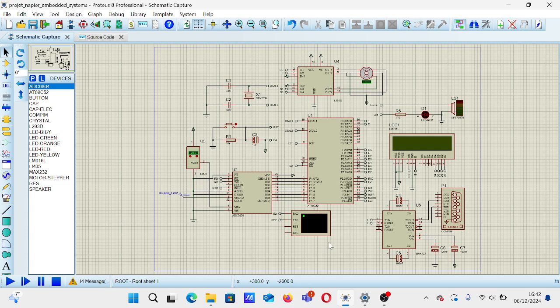It allows the system not only to send values to the PC, but also to be fully controlled using command keys. For the LCD screen, as you can see, the module features 14 pins, 8 of which serve as data pins, but only 4 data pins are used in this design to conserve microcontroller pins. Finally, the assignment requires informing the user when the temperature exceeds the selected maximum temperature.